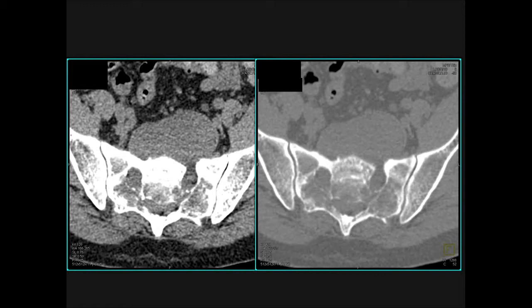Could this be a plasmacytoma? I would consider it, but then the bone would be more expanded. Could it be metastasis? I also would expect more bony destruction. Could this be a soft tissue sarcoma in front of the spine pushing in? Theoretically, yes, but unlikely. Sometimes you see rectal cancer growing upward, but that's markedly irregular. And this is very smooth.